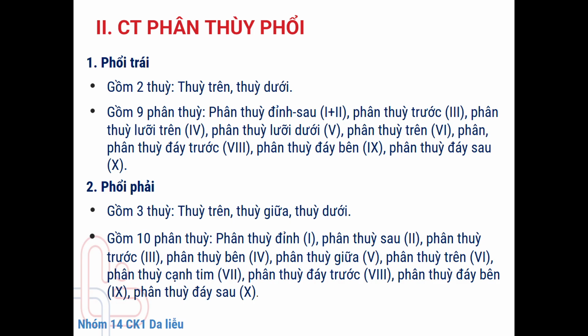Understanding pulmonary segmental anatomy on CT is essential because each segment functions as an independent anatomical and clinical unit with its own bronchovascular supply. Segmental analysis allows radiologists to localize disease with precision, improving diagnostic accuracy for conditions such as pulmonary embolism, tuberculosis, and early lung cancer.